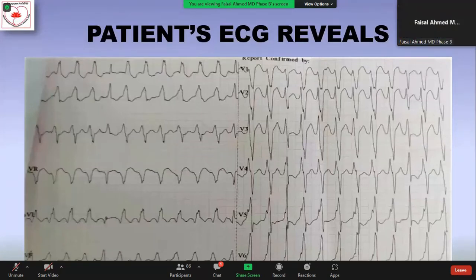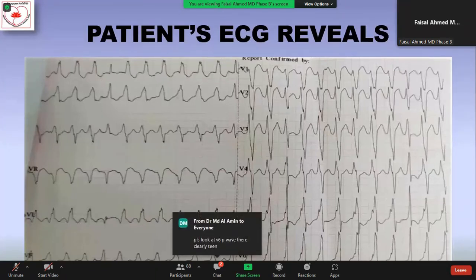Well, in case of ventricular tachycardia, actually ventricular rate is always more than atrial rate. So P waves are rarely seen, and as there is a clear demonstration of capture beat, in a single lead there are two capture beats with a simple sinus rhythm with a regular P wave. We can easily say that there has been a complete AV dissociation. And in other cases of VT, where P waves are not readily visible, we can use the demonstration of Lewis leads that can make the P waves more readily visible in case of ventricular tachycardia.